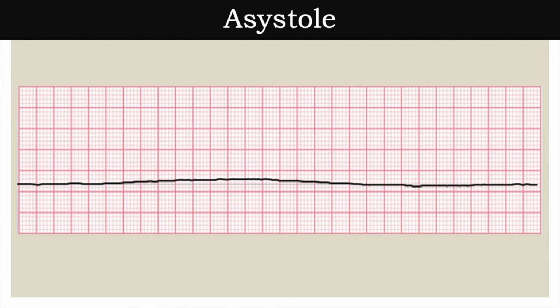And then the last one that we're going to talk about is your asystole, which is the one where your patient is basically dead. So you're going to obviously assess for pulse. Obviously, there's not going to be a pulse. You're going to call a code, and you're going to do CPR. In this case, you're not doing defibrillation because there's nothing on the monitor. It's just a line. There's no electrical impulse at all. Okay. In ventricular tachy and VFib, there was an electrical current. But in this case, there's none, so you do CPR and you administer epinephrine.